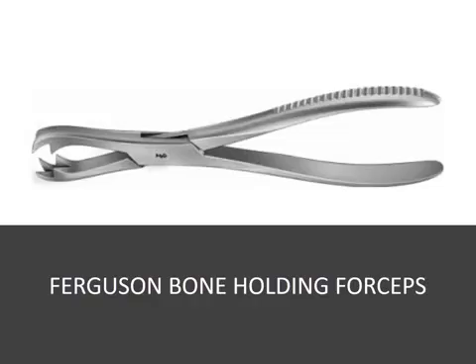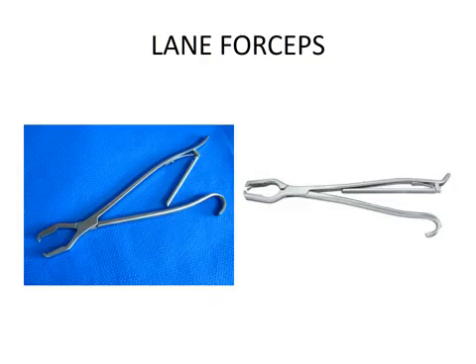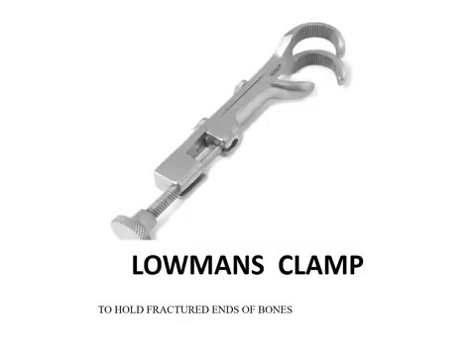Then further, previously we had these types of forceps for bone holding. The Ferguson bone holding forceps. They again have teeth, and the Lane forceps, which again has teeth at the ends. So what I want to tell you, whenever there are teeth, they are holding the bone. And then we have a Lowman's clamp, which is also used for holding of the bones along the reduction, right?